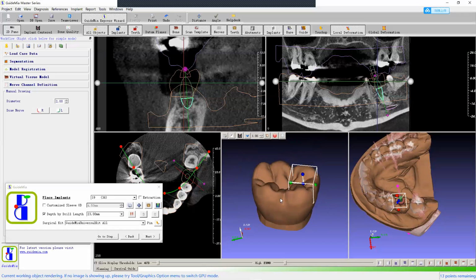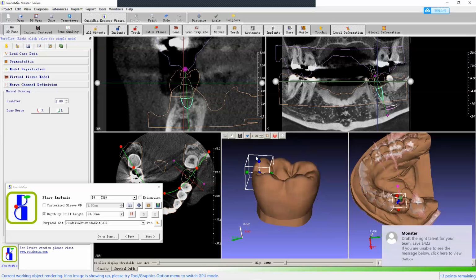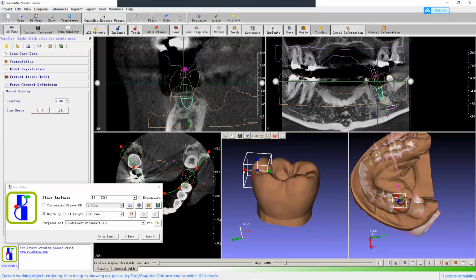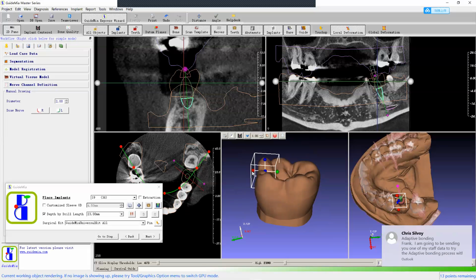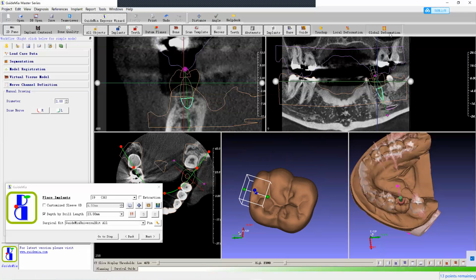If you want to check here, for example, you double click this spot, then you go up. Then you can even go in the other direction. So we can do that. Okay, that's the local deformation. Then you finish this global deformation.